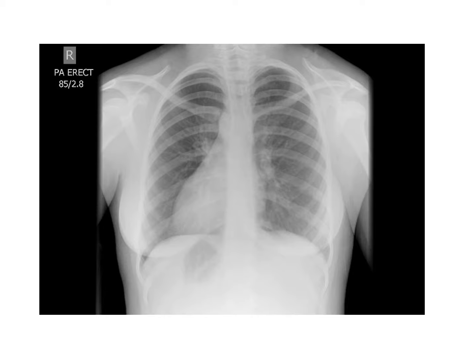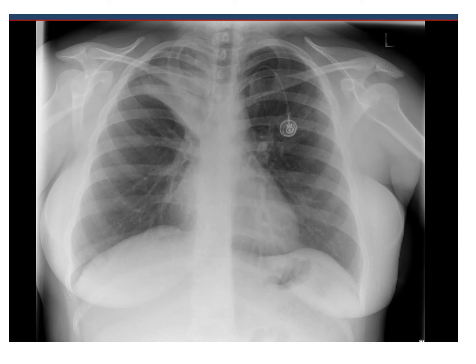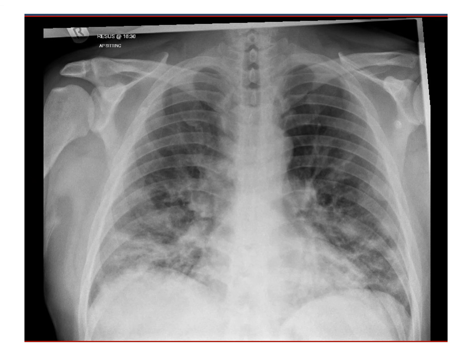This one is situs inversus, or your dextrocardia. This is a cystic fibrosis patient, and it's a right upper lobe collapse. This again is a right upper lobe collapse. This one is bilateral patchy consolidation in the mid and lower zone, and is COVID-19.